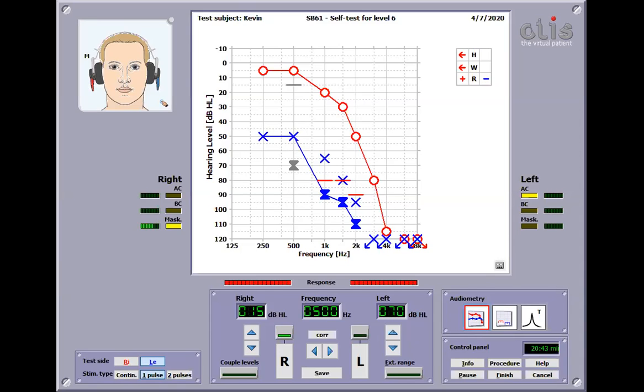Okay. I try the first 10 dB plateau. Shouldn't, yeah, no, there's nothing. First 10 dB plateau, nothing. We increase the signal level. Okay. That's about it, I think. Ooh, okay, it's going down more.